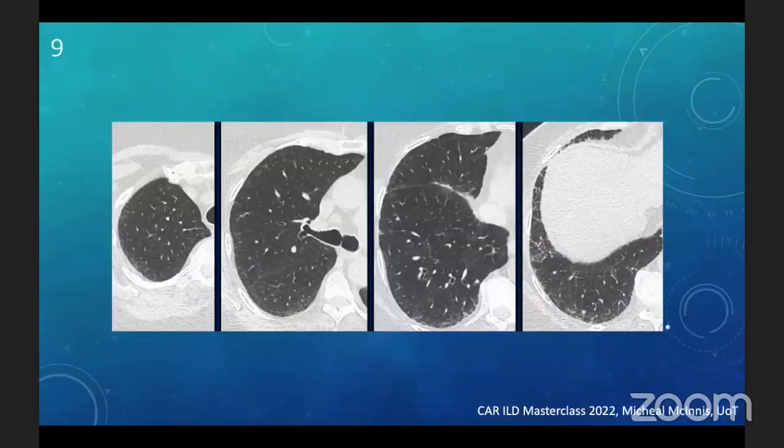Now, let's have a look at this one. There's very mild burden ILD. Someone would have even ignored calling this an ILD. It's really very minimal, right? It's a basal and peripheral predominant disease, predominantly characterized by fine reticulations. Maybe there are some areas of ground glass in the lung bases. Maybe there is some traction bronchiectasis at the periphery of the lung, but not really like frank fibrosis.